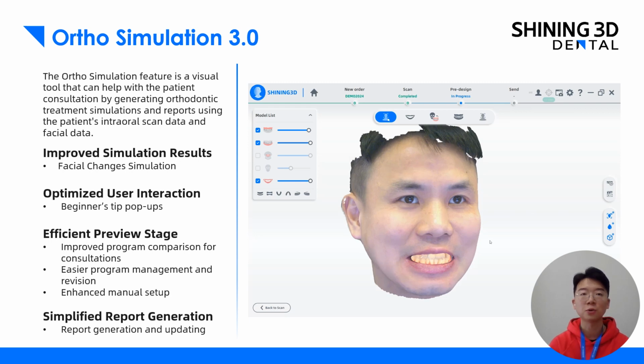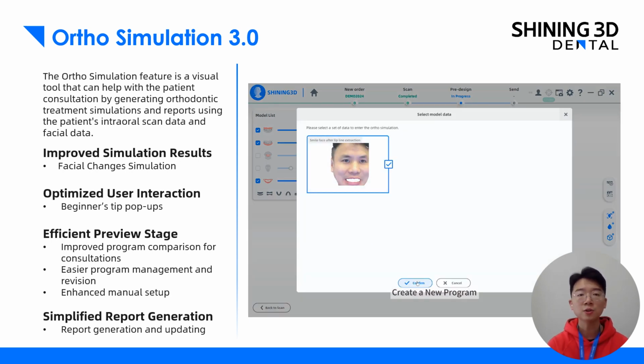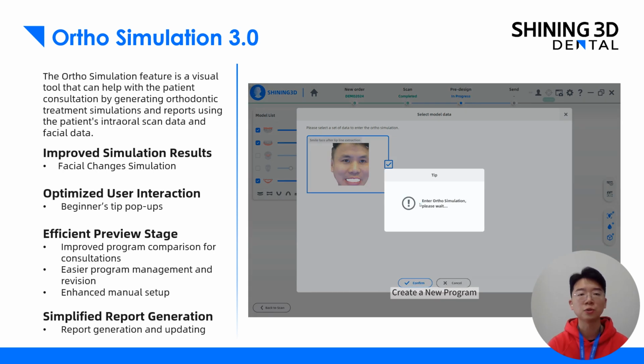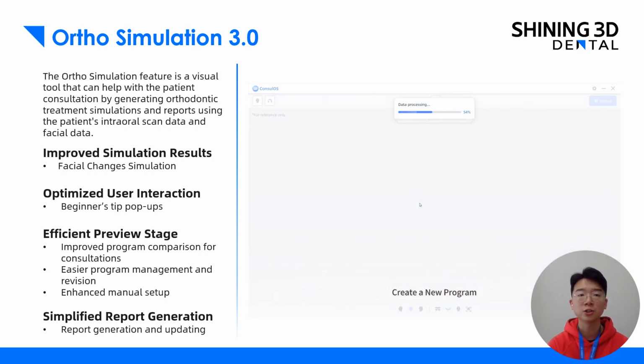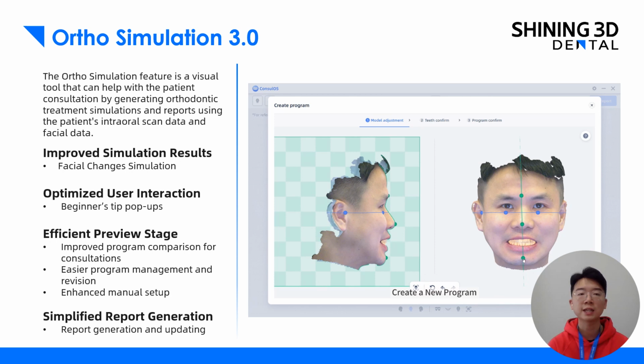Here is an overall introduction about this Ortho Simulation 3.0. The Ortho Simulation feature is a visual tool that can help with the patient consultation by generating orthodontic treatment simulations and reports using the patient intraoral scan data and the face scan data.